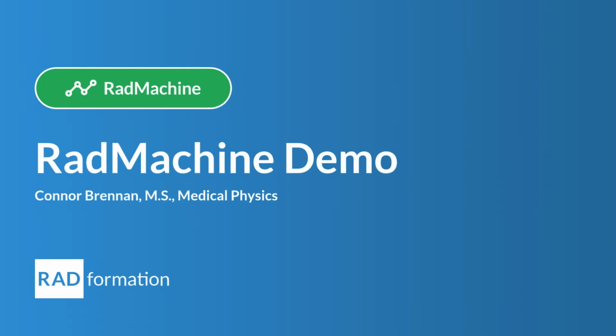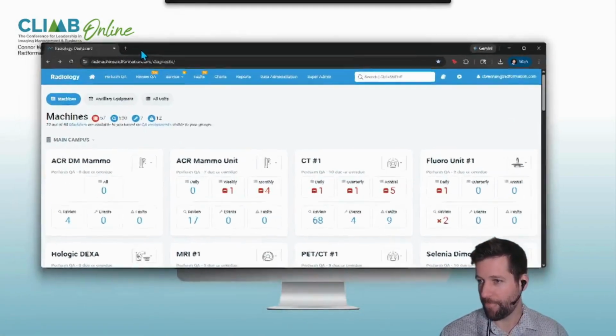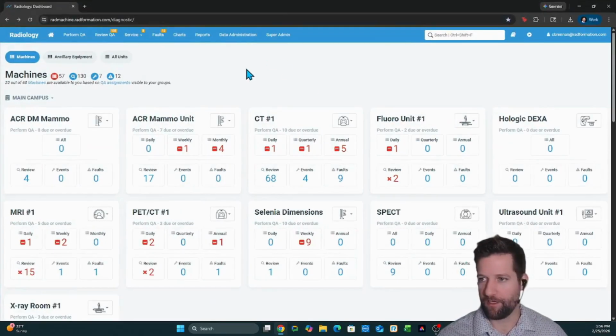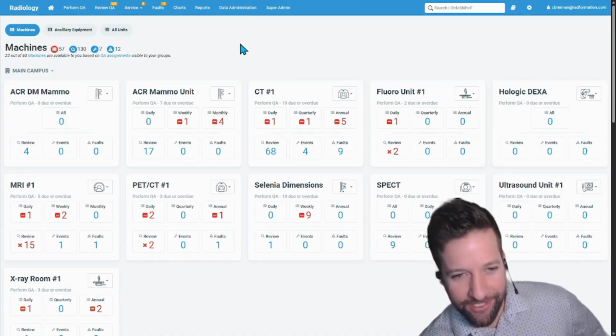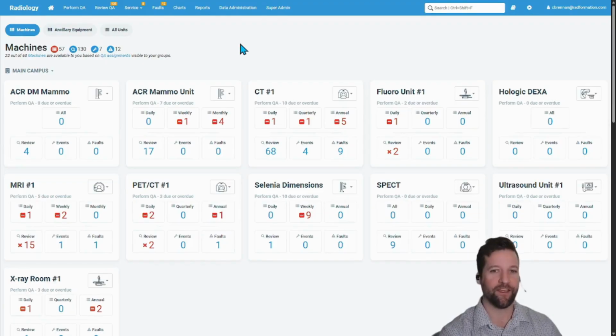Okay, we're going to do a little RadMachine demonstration now. So I'm actually going to open up the software here. Let me drag this over. Okay. And this is RadMachine itself. So kind of our home page here that we might be looking at.